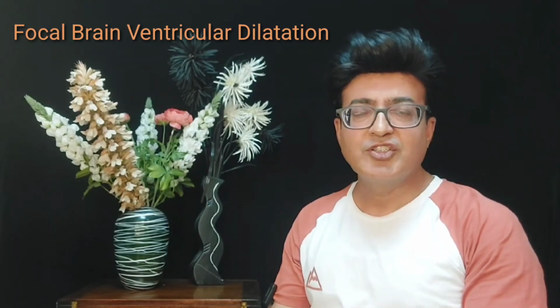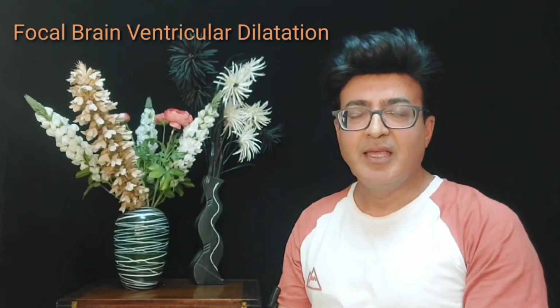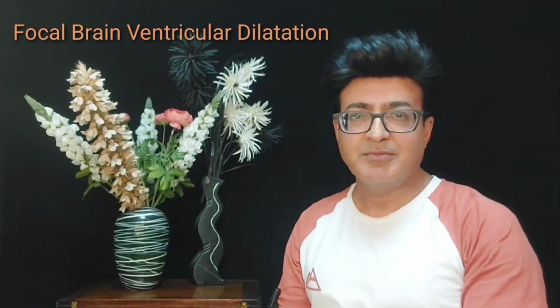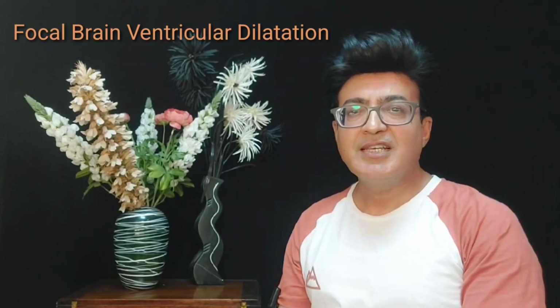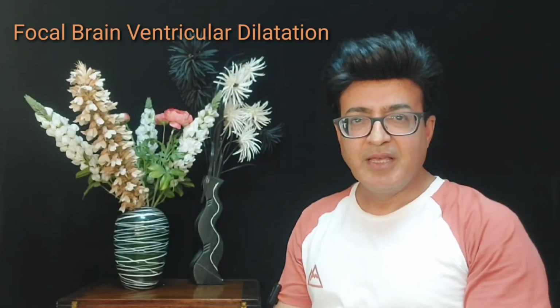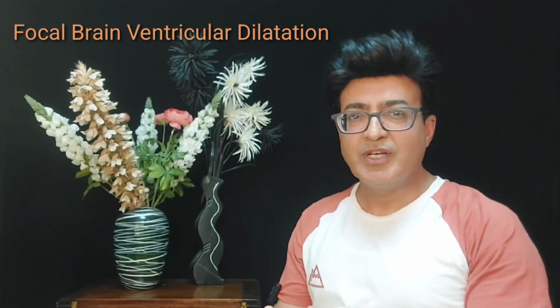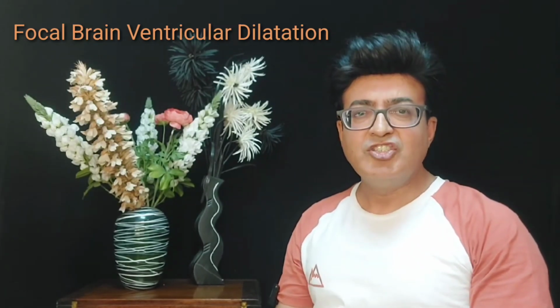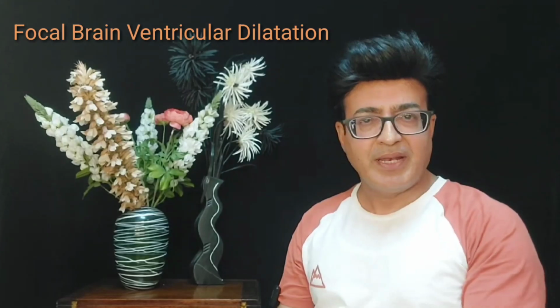Today, the topic of discussion is ventriculomegaly or focal lateral ventricular enlargement or dilatation. In the setting of senile brain assessment, CT scan shows ventriculomegaly because of the secondary degenerative changes of the brain parenchyma.